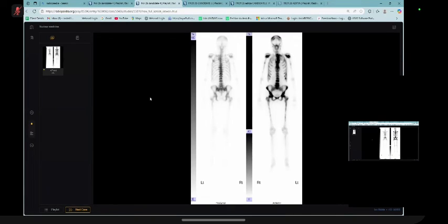Sir, that was the myeloma case. You should say that I'm suspecting this patient has multiple tiny lytic lesions. It could be myeloma, it could be metastasis. I would like to go ahead and discuss this patient with the clinician. For this, I would like to send this patient for the bone lesion MDT to further work up myeloma, and we can decide about MRI or the bone scan for that patient, something like that.